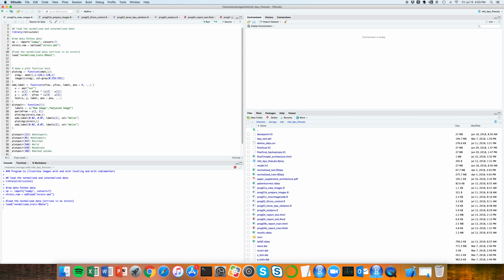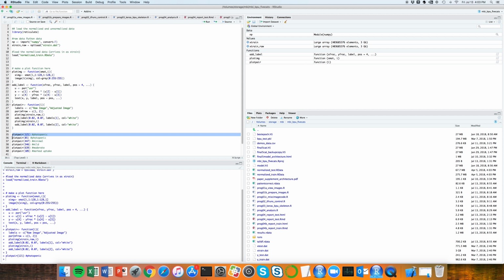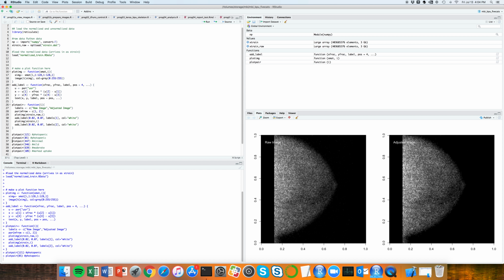So one of the things we want to do is create a visualization of that. So we can start with an example. This is one of the cases. It's photopenic. You can see how the brightness changes ever so slightly between the images. What I'm doing is truncating off the top if it's, say, brighter than white, and also leveling out the bottom to make the black a little bit deeper. So there's an example of a photopenic image.